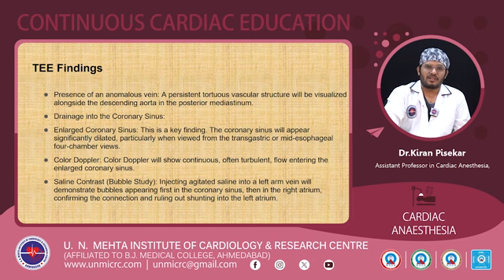Now, what will be the TEE finding in this? There will be the presence of an anomalous vein. A persistent tortuous vascular structure will be visualized alongside the descending aorta in the posterior mediastinum, draining into the coronary sinus. Because this is draining into the coronary sinus, there will be added blood coming into the coronary sinus, leading to its dilatation. So the coronary sinus will be enlarged. We can see the color flow, which will show continuous, often turbulent flow entering the coronary sinus.